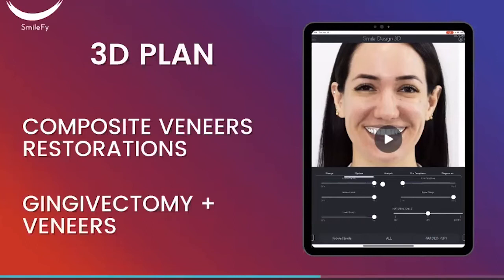So now I'm going to share my screen. Instead of using my iPhone version, which you guys already saw, I will use the iPad version, okay? The reason I'm going to use the iPad version is that the screen is much larger, so it's easier for you guys to visualize what I'm doing here.